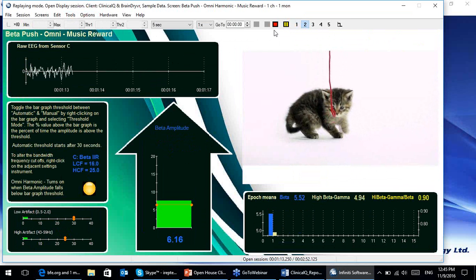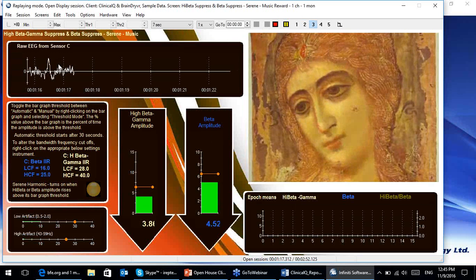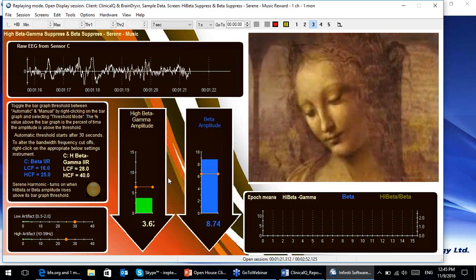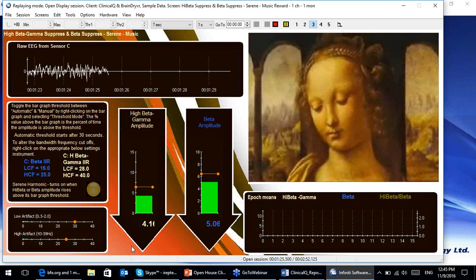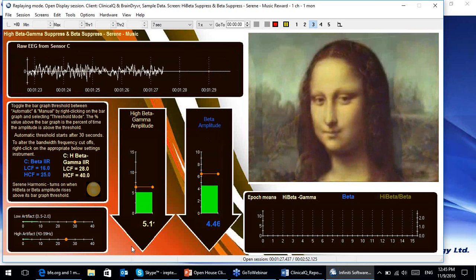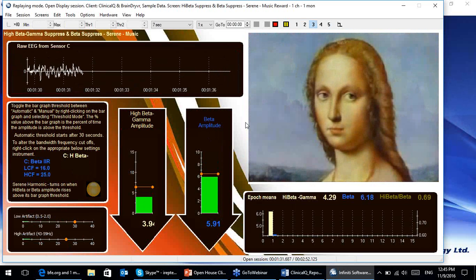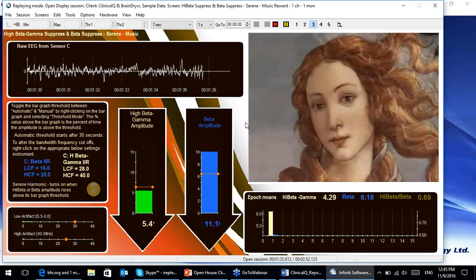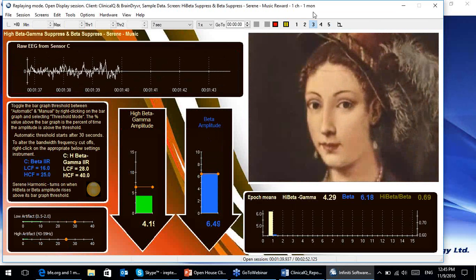As you can see, the look of this is pretty good. I'm going to jump to a different visual display, and we see how it's pretty consistent. Raw EEG at the top. We have arrows that let us know how we're trying to make the training go, and we have the instructions on the side and artifacts. In the old training screens, it was a little bit jumpy. There was a little bit too much variation of how things looked, and people did not like that. So we listened to what people thought, and we made some changes. So now it should be much easier to follow. And I'm very, very excited and happy with that.